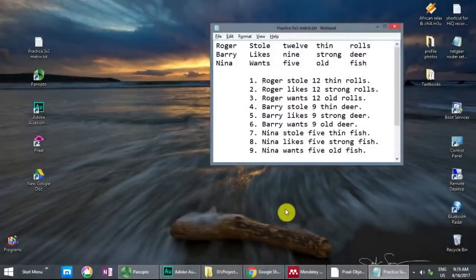In this video, I will be demonstrating how to record and edit sentence materials for the development of a sentence matrix test in a language of your choice, although I will be using English sentences as examples so that we can all follow the process.